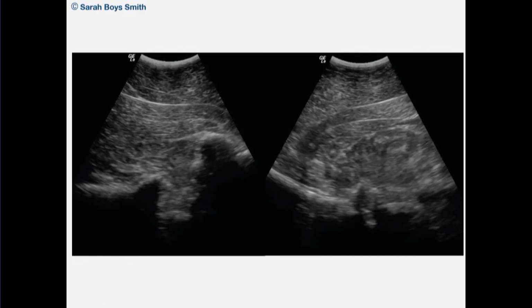And then just another example of how severely abnormal, significant disruption of that normal architecture that we can see. So we've got the close proximity, basically, of the greater trochanter to the hip joint. So we've sort of got, again, a concertinaing effect of those two bone surfaces. So they're not positioned as you would normally expect them.